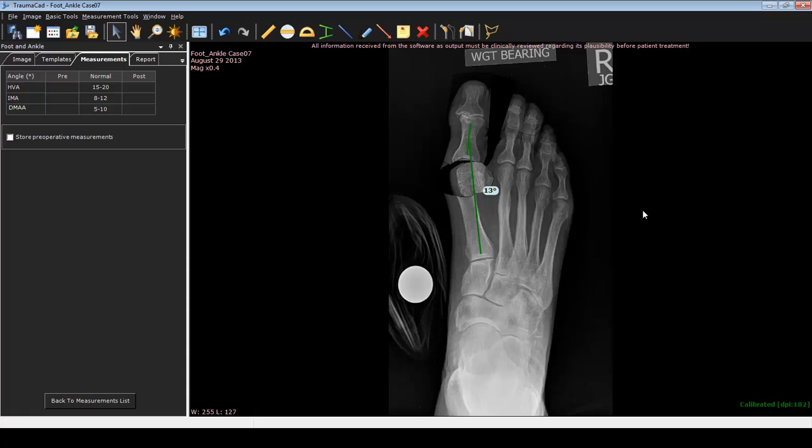If we are happy with this, we've planned out that we would have to make a shift of about 7 millimeters, which corresponds to the amount of fibular sesamoid uncovering. And we're going to correct from our preoperative hallux valgus angle of about 30 degrees to about 13. And this is one of the simpler ways to use this program. It's very effective in teaching and can tell you that your soft tissue correction, combined with your bony correction, should get you a more rectus, normal looking foot.